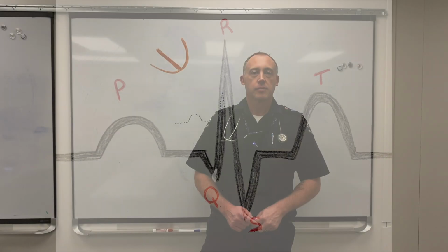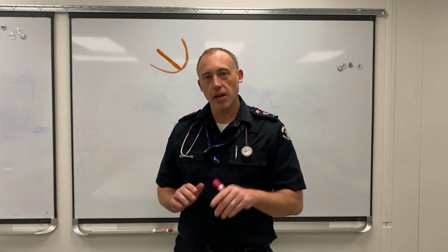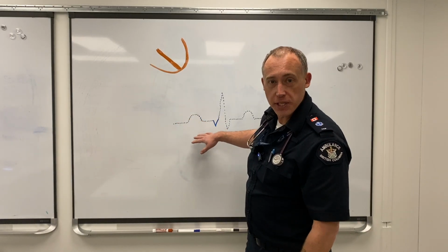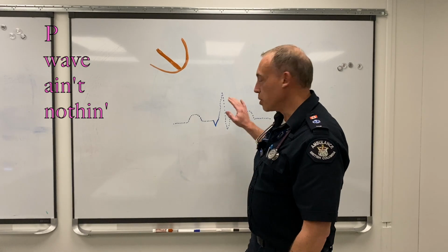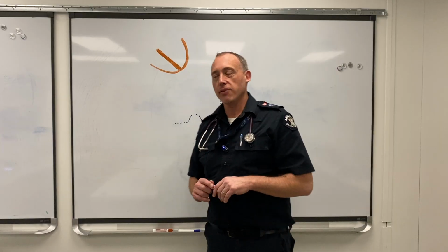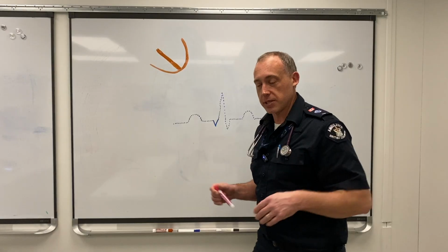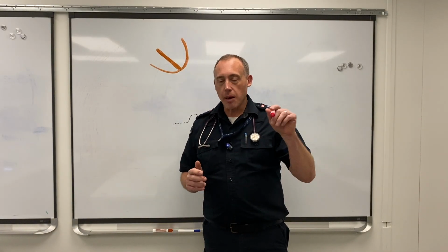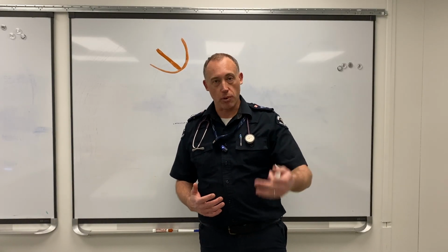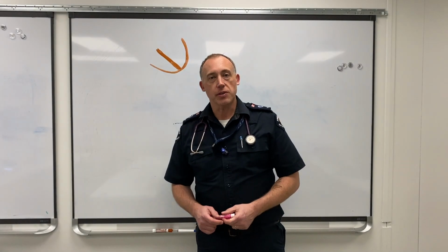Okay, guys, so welcome back to ECG Extravaganza. Really excited because today we're done with the P wave, we're done with the PR interval. So we're going to move on now to very exciting things, the Q wave. Yep, the Q wave is very exciting. It's the first wave of the QRS complex, which makes sense. And it's also something that can be normal, but can also be what we call pathological, where Q waves can represent a problem, usually ischemic or dead myocardium or heart muscle.